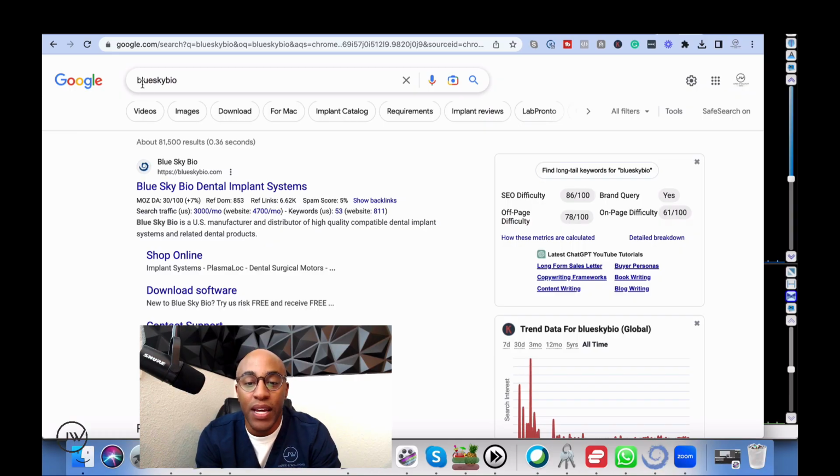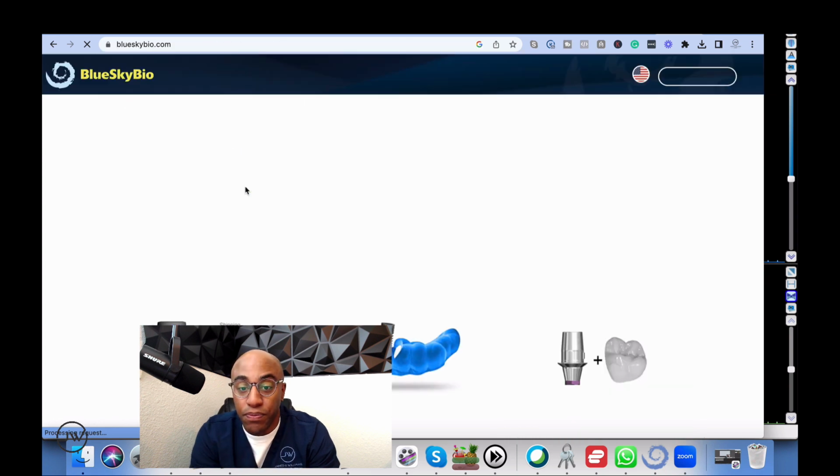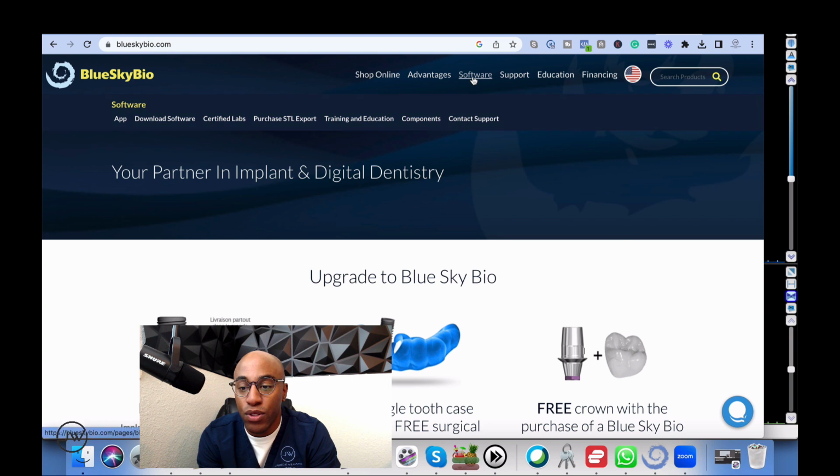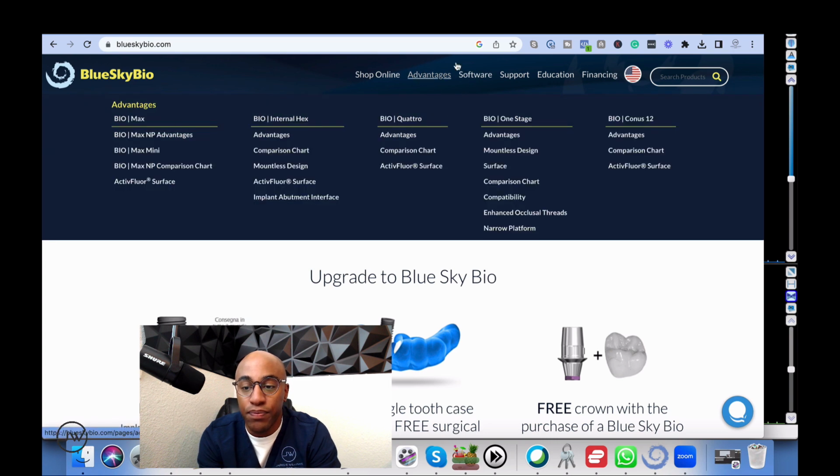And that's called BlueSkyBio. So I went ahead and placed it in my Google search here, and we're going to click on it. So this is actual software that I use. It's phenomenal. You go ahead and grab the software here, click advantages.